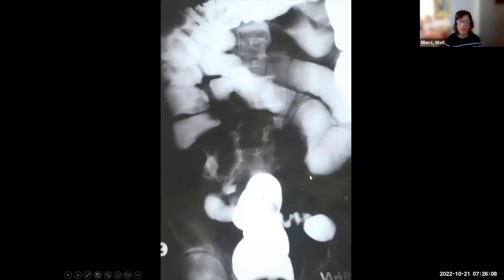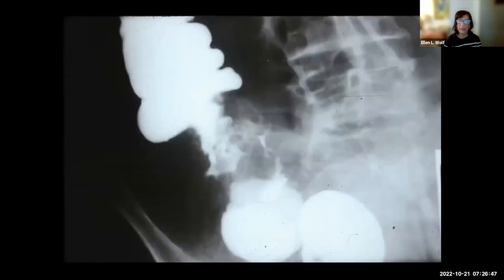So one example, this patient came in with lots of dilated small bowel loops, looked like a distal small bowel obstruction. Contrast was put in per rectum and introduced throughout the colon, and we can see that there was a right colon cancer in the region of the cecum, which was causing a small bowel obstruction. So this right colonic lesion was causing obstruction. It was right at the ileocecal valve. It was causing small bowel obstruction, but was diagnosed as right colon cancer, which was much quicker than doing it from above with barium, doing it from below. And this is the spot film of the tumor.